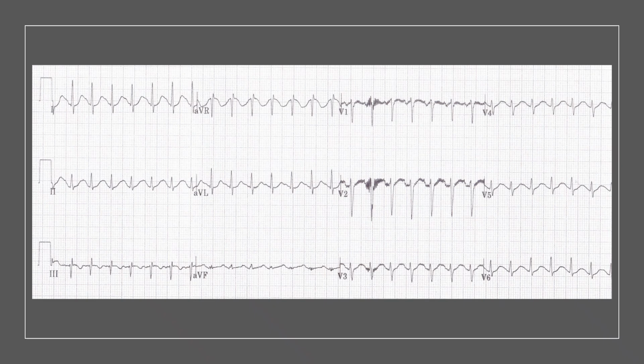So what I want you to do now is pause this video, have a proper look at this ECG, see what you think, have a diagnosis and a management plan in your head, and then we'll take it from there. Okay, welcome back. I hope you've done as we agreed. And let's have a look at this ECG and see what we can come up with.